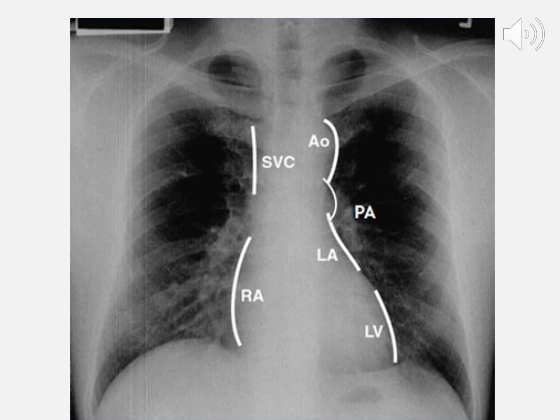You can also see the trachea and the left and right main stem bronchus. They're a little hazy in this one, but again, this is just for study and review. Look at this slide, put it in your brain. We're going to talk a lot more in depth about these things as we move forward.